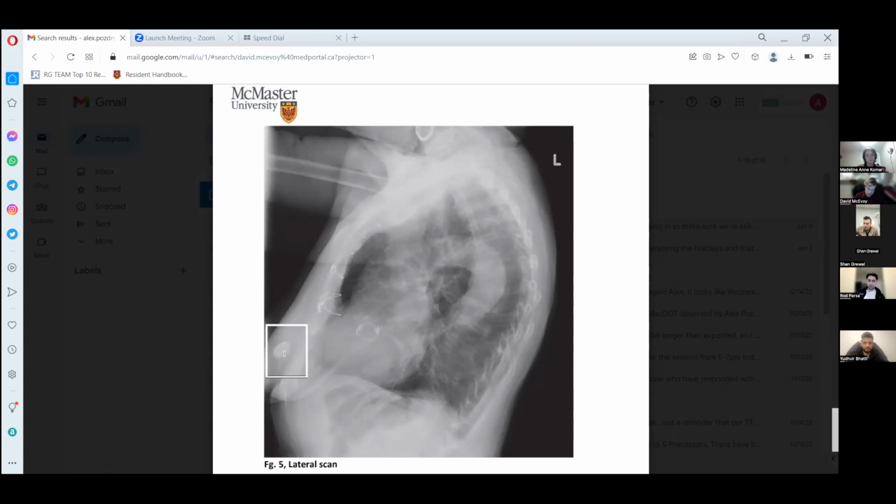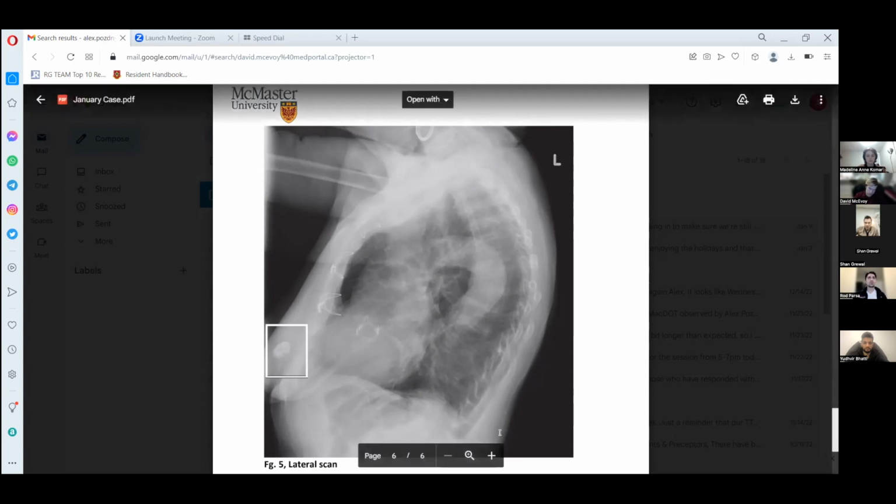And this would probably prompt further investigation with maybe a mammogram, like you will learn later. It's definitely way above your level of training, but some breast lesions can look a bit more benign. Some look more aggressive, and certainly they might need to have this investigated further.